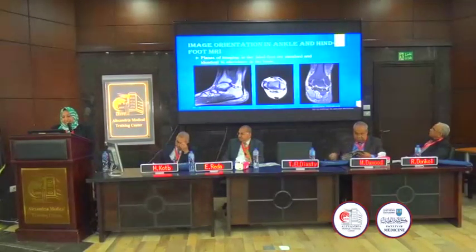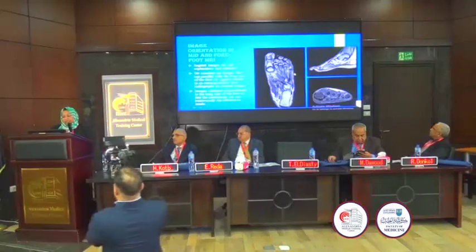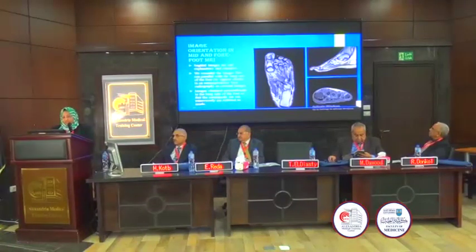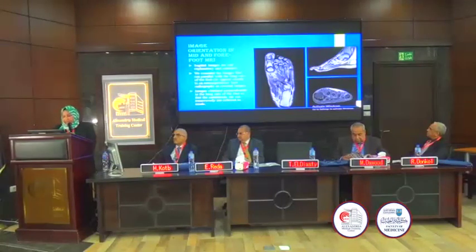It's important to say that the planes of imaging of the hindfoot are standard and identical to elsewhere in the body: the sagittal, axial, and coronal. While in the foot the sagittal images only are standard, but the coronal images and the axial images are perpendicular to elsewhere. I mean that the images that run parallel to the long axis of the foot, which appear similar to the plain X-ray posterior anterior view, are the coronal images, while the images which are perpendicular to the long axis of the metatarsals, so that the metatarsals appear as transverse cuts, are referred to as the axial cuts.